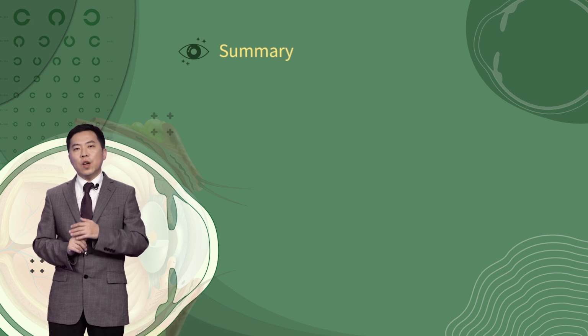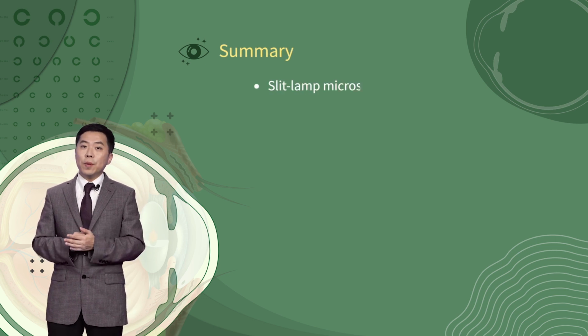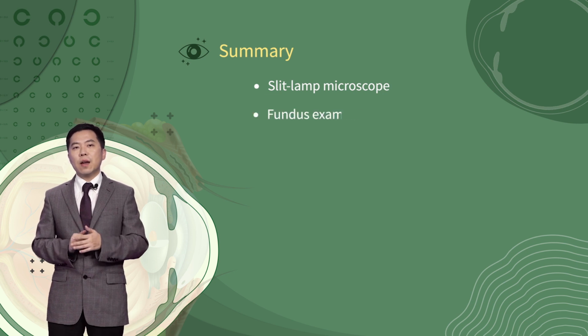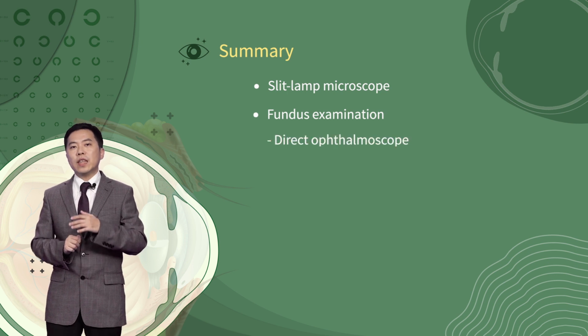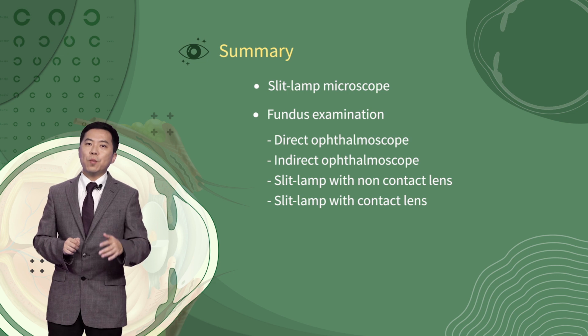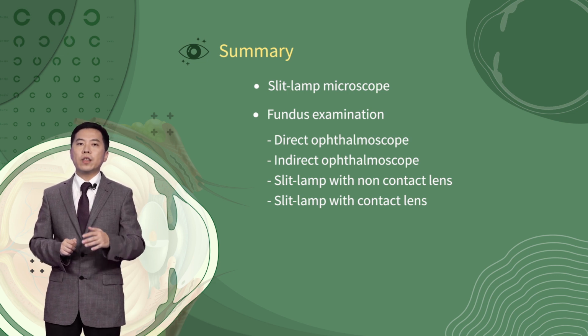In this section, we talked about the slit lamp microscope, which is used for the anterior segment, and several techniques for fundus examination, including direct and indirect ophthalmoscopes, and slit lamp microscope with non-contact and contact lenses.